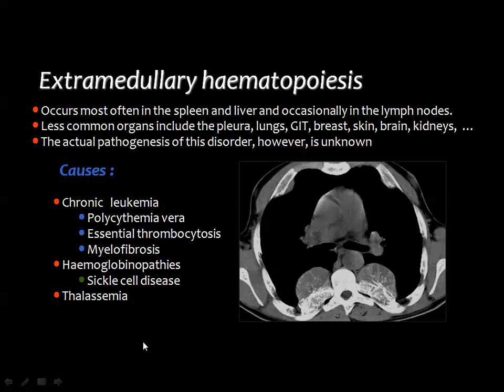And you know, in cases of bone marrow depression or in cases of decrease in the red blood cells, there should be evidence of bone marrow hyperplasia in the form of the expansion of the medullary cavity, especially of the ribs, and the appearance of trabeculations inside the affected vertebrae and the ribs.